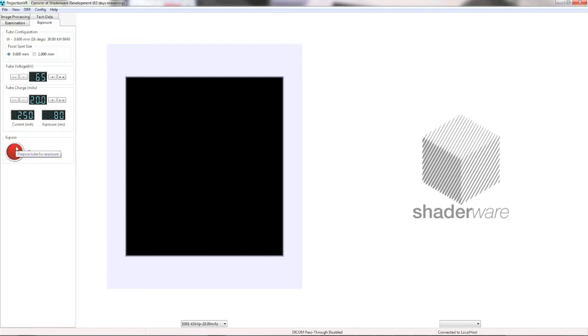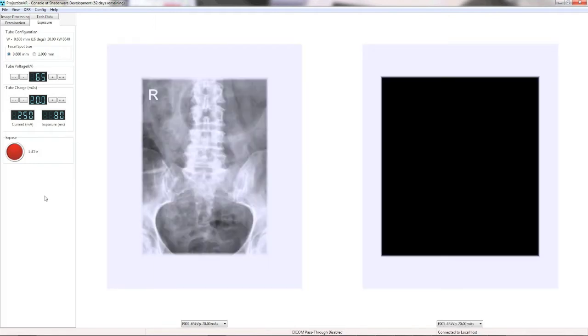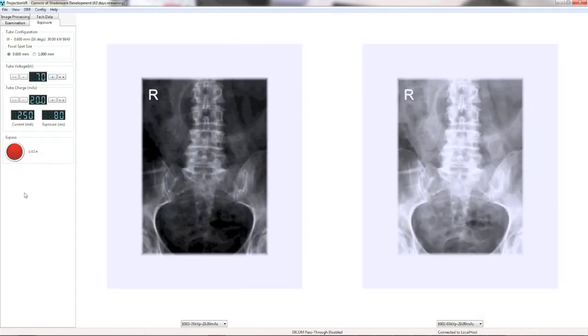It can be easily set up as a modality on a PACS system, providing DICOM data that meets international conformance standards, and it can operate as either a CR or DR X-ray room. The potential all this rich functionality provides you as an educator is vast. In your hands, given some time to explore, many possible areas of the curriculum can be enhanced.